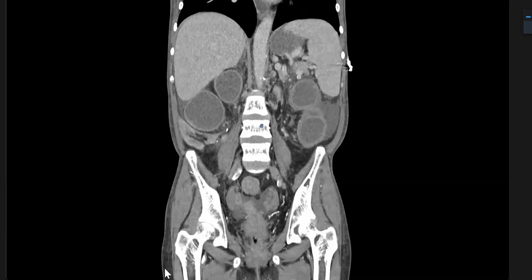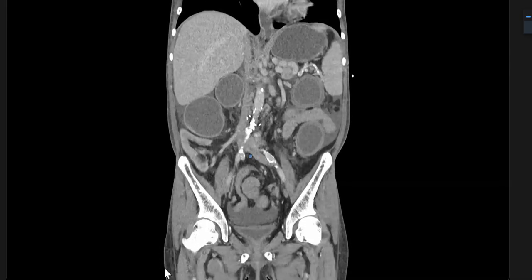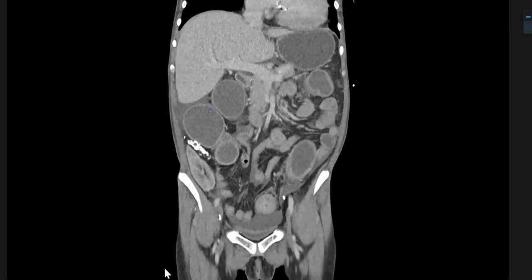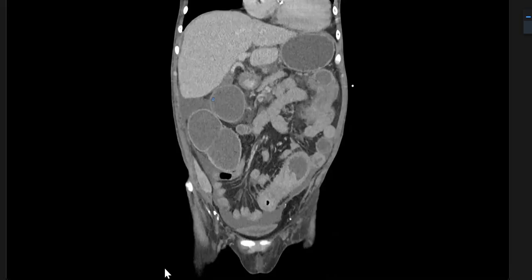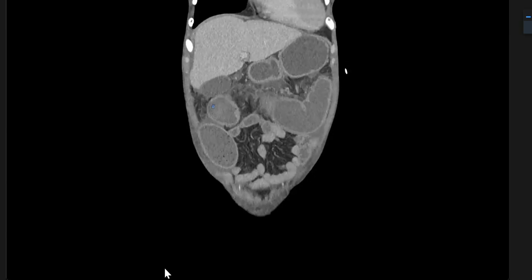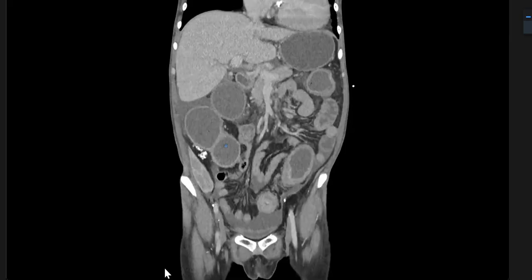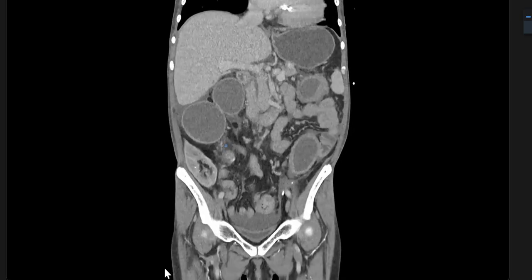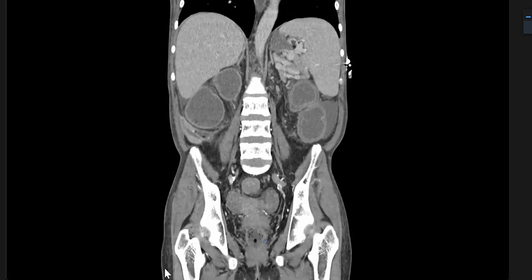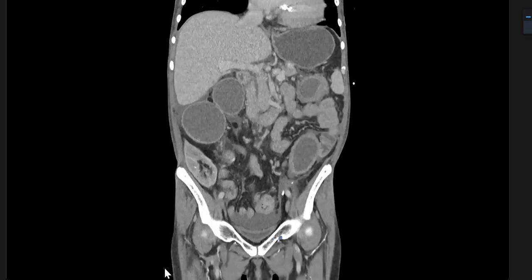Patient is vomiting and in pain now in the department. I would like to know the age and the gender of the patient. How does it matter? What do you think? What is the gender? I think it's a male patient and an adult. You think it's a male patient? No, it's a female patient.